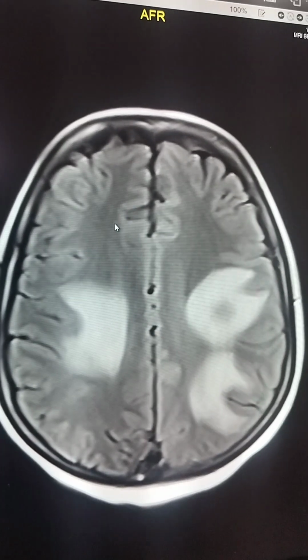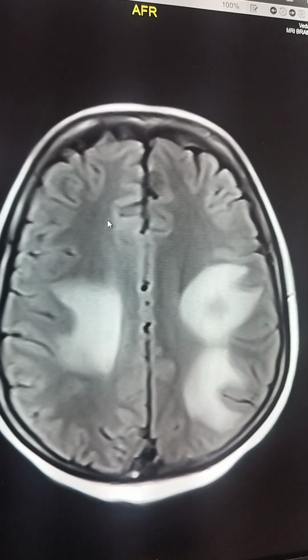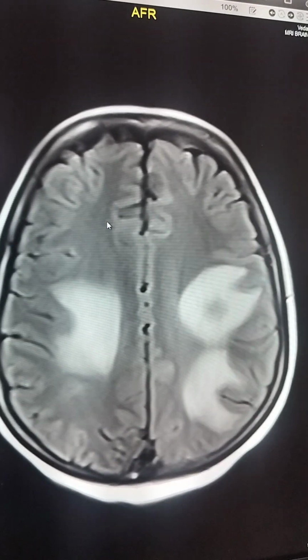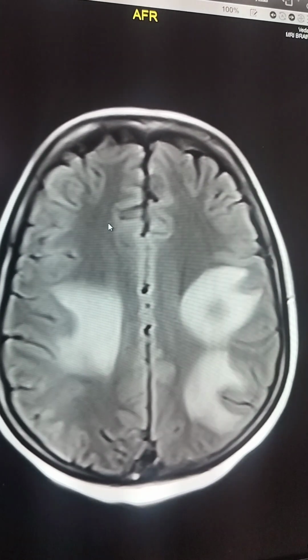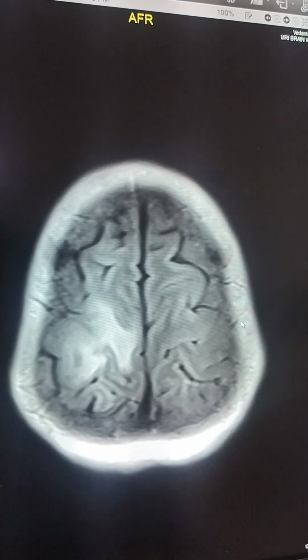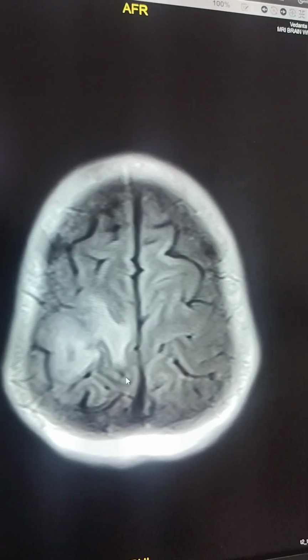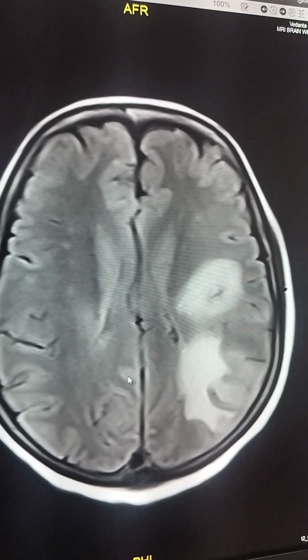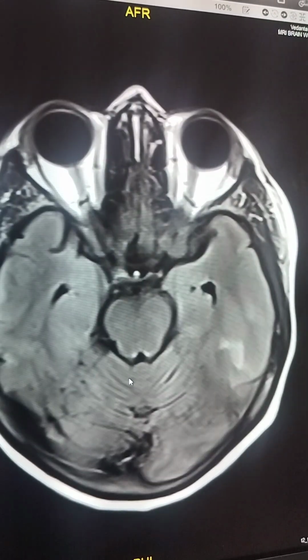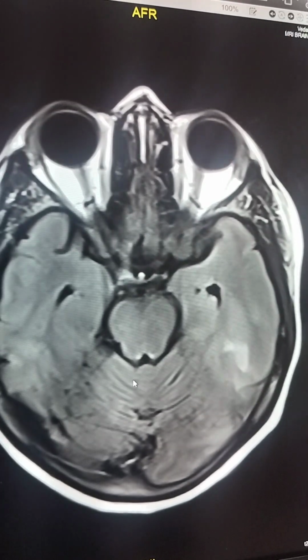Why is it not a granulomatous lesion like tuberculoma? Tuberculoma is possible, but the hemorrhagic nature favors metastasis more over tuberculoma. So this is not an assumption. We have to go for evidence-based diagnostic imaging.